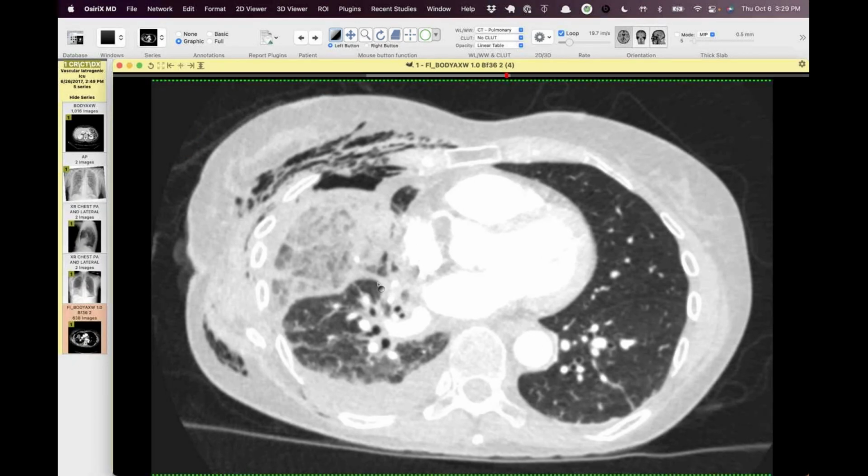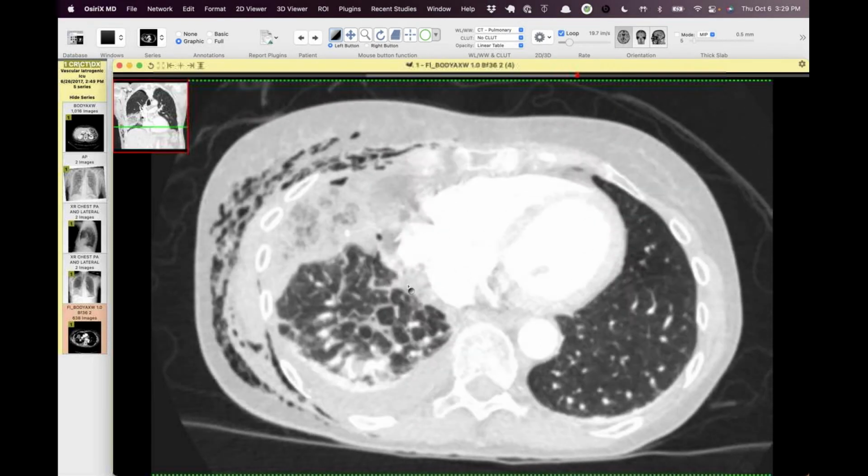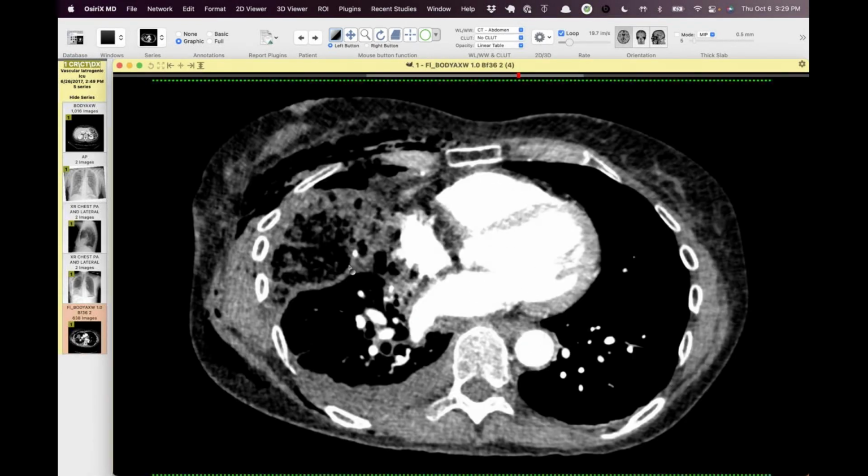There's a big staple line right here. You can see everything was stapled across, and the full right upper lobe is still intact here, the anterior segment and posterior segment. So it's not like they accidentally ligated a portion of that. It's just strange. But it's really overdistended there.